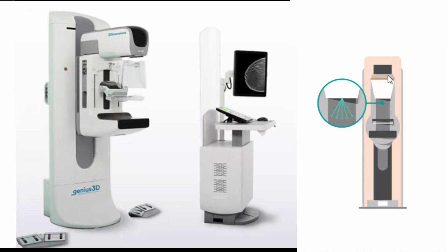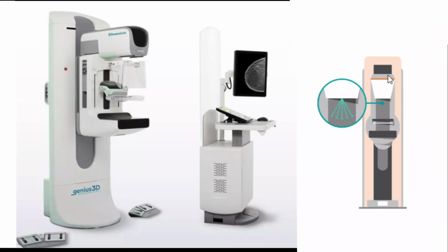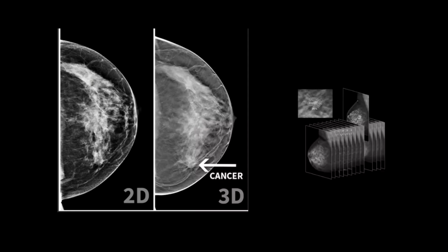The principles and physics of mammography remain the same, despite the different types of manufactured equipment or modalities available in the market today. A thorough knowledge of the components of the equipment and how to optimize their use will result in quality mammograms. So let's begin to explore the equipment utilized to create 2D and 3D digital mammograms.